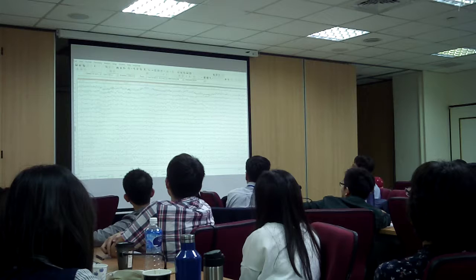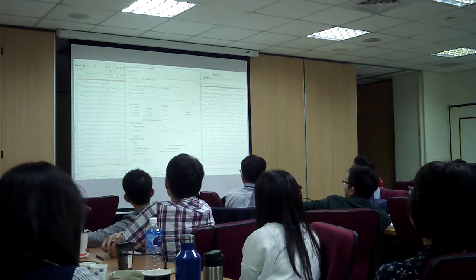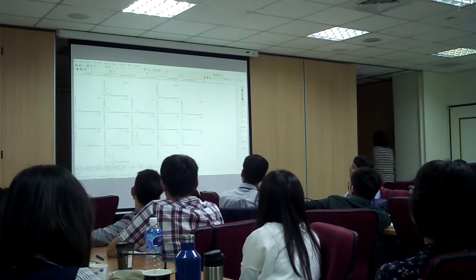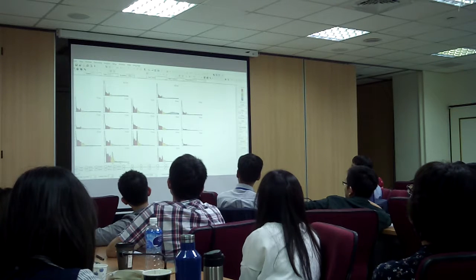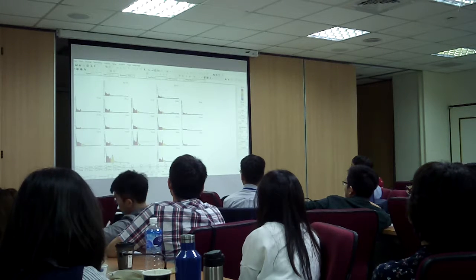So let's look at the raw spectral analysis. We're going to see some high beta, but it's the EEG. So there's your discharge right there. And look at that, we've got PZ and P4. So see the peak alpha frequency?